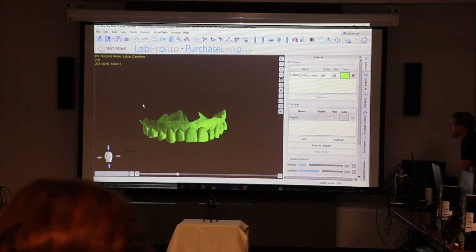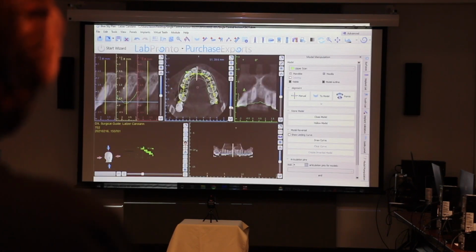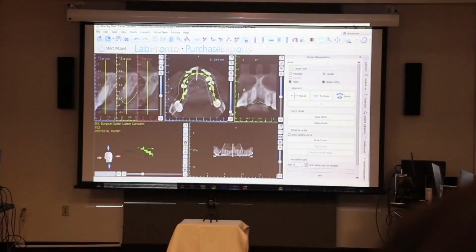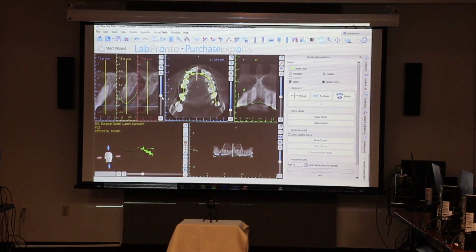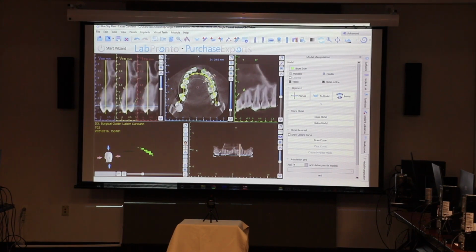I've actually got the wrong model in here as well. So I'm going to, all right, so I've got the correct model here now. So I check my cusp tips, I'm all aligned, everything's lining up. My outline is lining up nicely on my teeth here.